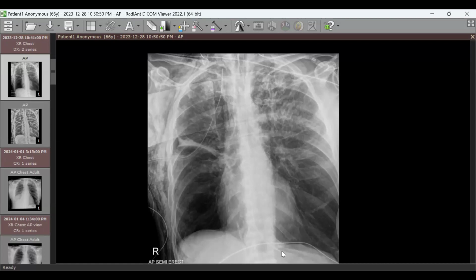Is this satisfactory? If they send you this X-ray and ask, can we start feeding the patient? What do you tell them? Sir, this is high in position. Yes, we need to push it down a little, this level is considered high. The normal level would be nearly about 10 centimeters, reaching the fundus, 10 centimeters from the gastroesophageal junction.